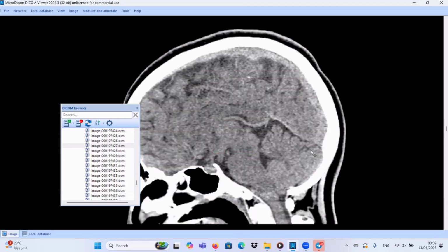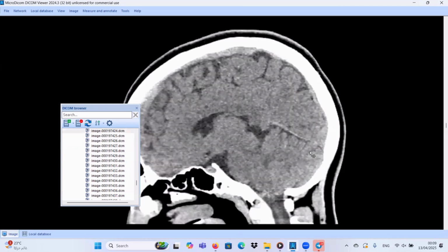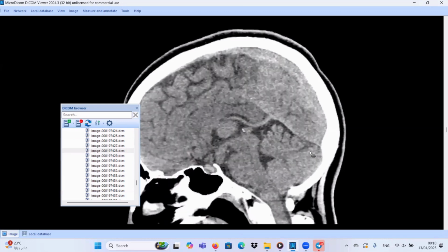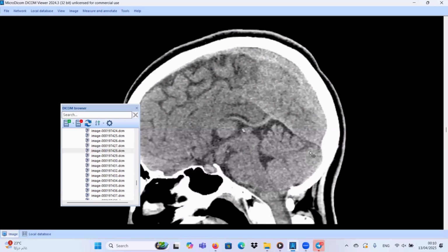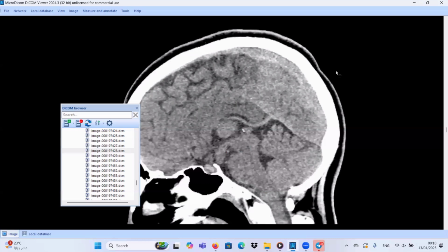One of our most important differential diagnoses in this case is hypothalamic hamartoma. Hypothalamic hamartoma can explain the seizure attacks of the patient. The second differential diagnosis for this case is hypothalamic glioma and hypothalamic metastatic lesion. We have a list of differential diagnoses for hypothalamic masses, but in this case, contrast-enhanced MRI scan is very important for better characterization. Let's move to our next case.